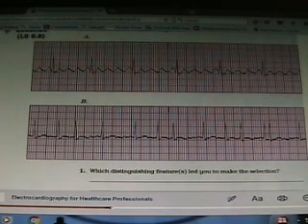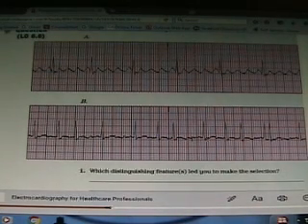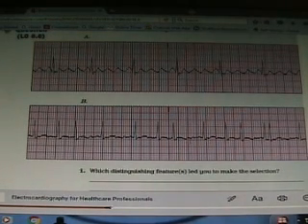There's nothing even remotely coordinated about what's going on here on your baseline. Well, good news, if there isn't any good news here, the QRS is still good, but the P wave is so messed up that it even obscured the T wave. So that's how you know that's atrial fibrillation, also known as AFib. And the other one on top, trace A, is atrial flutter. So that's flutter versus fibrillation. And they sound alike, don't they? Could that be one trace and the other one be the other trace?